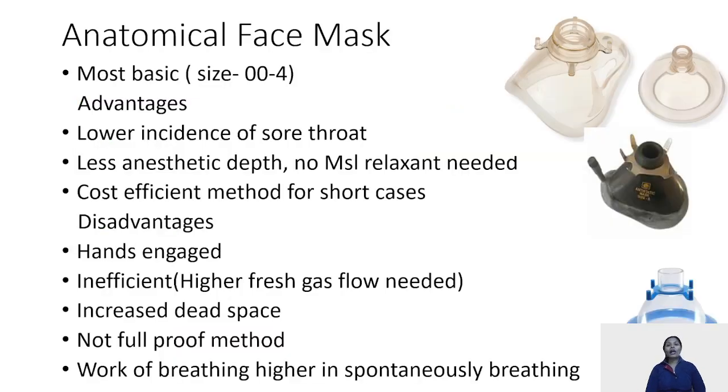Now, talking one by one about the airway equipment. I've already told you this is more of an image based class. So please look at the images very carefully, because generally most of the images of anesthesia come from this airway equipment part.